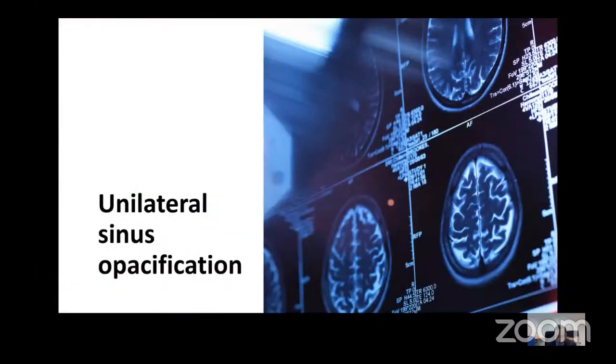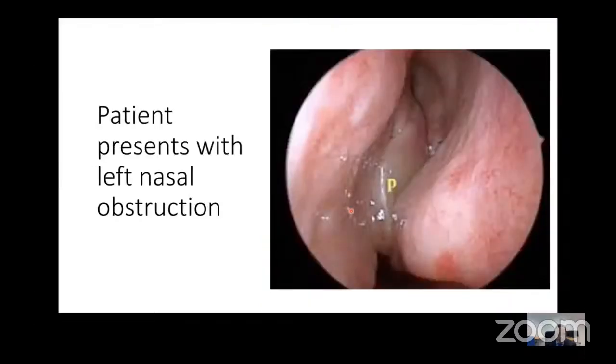Now we go to the next section, which is unilateral sinus opacification. Let us go through some case scenarios for this. Here is a patient who presents with left-sided nasal obstruction. A nasal endoscopy shows a polypoidal or polyp-like lesion arising from the left middle meatus and extending posteriorly.